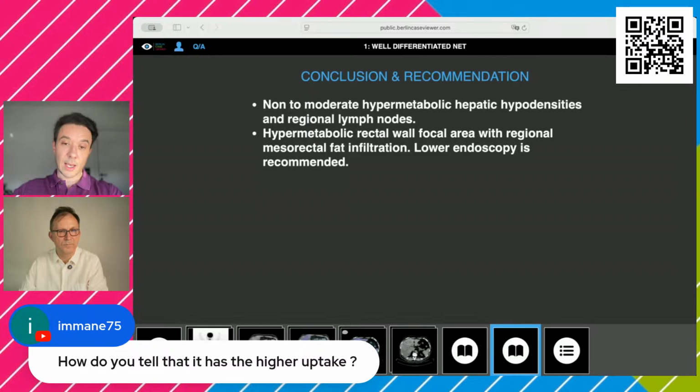And if there is dose infiltration and we can't repeat the scan, in these circumstances, I use the liver as a reference. In lung nodules, for example, first I take a look at the background activity. If it's higher than the background activity, then if it's higher than the mediastinal blood pool activity, this is when it becomes suspicious. Sometimes I call it mild. And then if it's higher than the liver activity, then I would go between moderate to intense uptake, depending on how it appears visually.